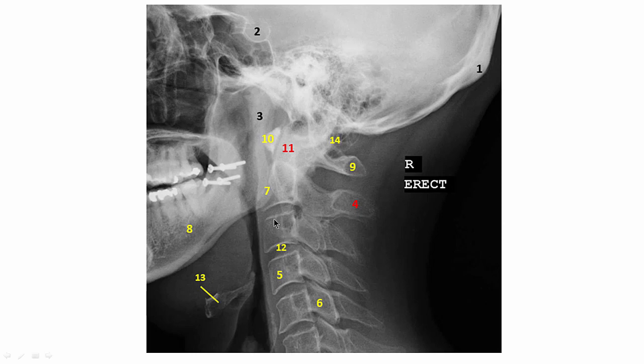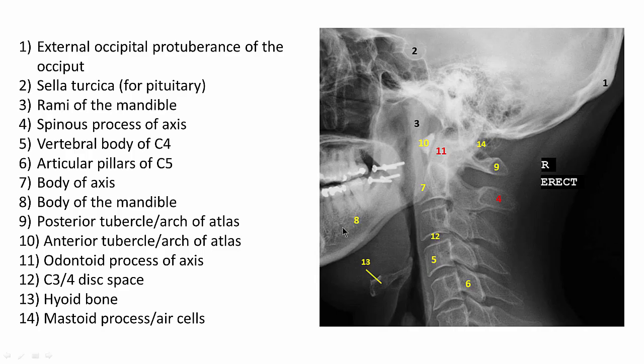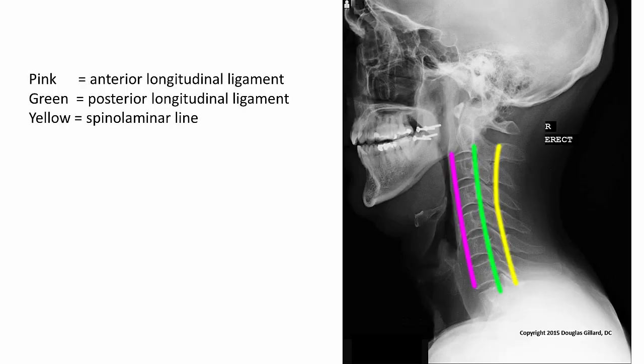See the transverse process here? It's like a little U. Here's another one. Here's another one. Transverse processes. There's your answers. Leave it up there for a few seconds. Okay, that should be good. Let's go to the next one.